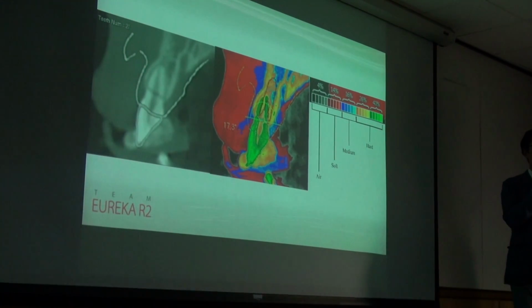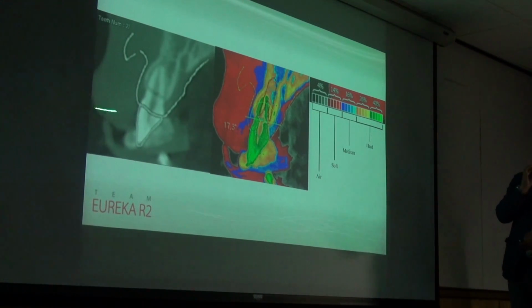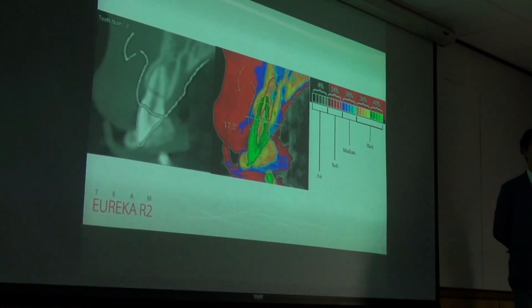Very intuitive ways. So, do you know this patient's bone quality? We don't know using a grayscale. But after standardization and changing the color code, we can easily know this patient's bone quality. How about this patient's bone quality? Yellow color here, hard bone. So before the surgery stage, we can get the patient's bone quality.